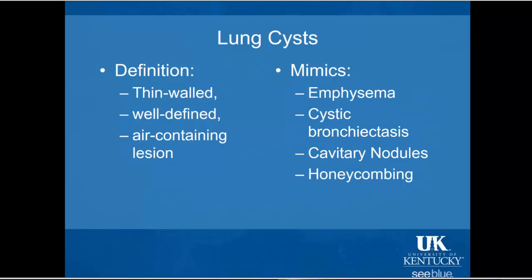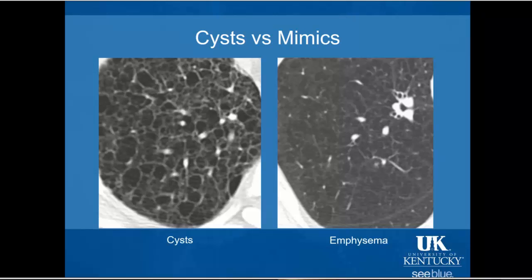When you see a diffuse lung disease that is a primary cystic lung abnormality, you should actually be pretty excited because they don't occur that frequently and they're always interesting, but really there's a relatively short differential of things that present like that. And it's been shown that you can, in most cases, give a fairly confident diagnosis and be correct about what the actual cystic lung disease is, especially if you have a little bit of clinical context.